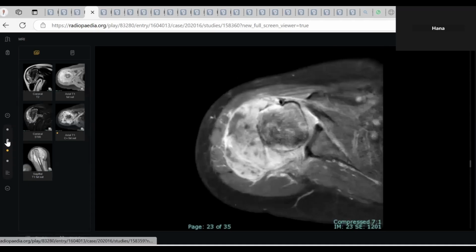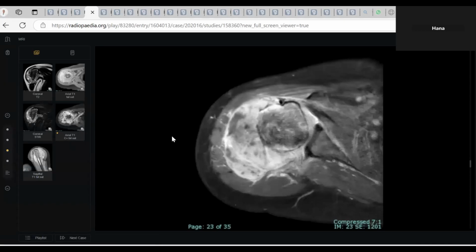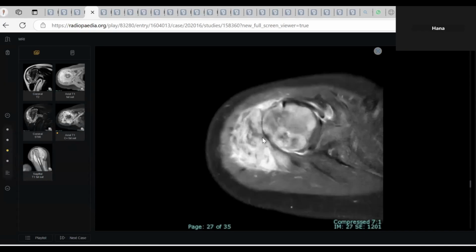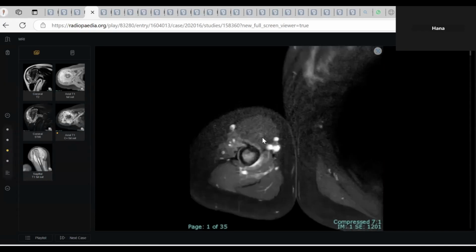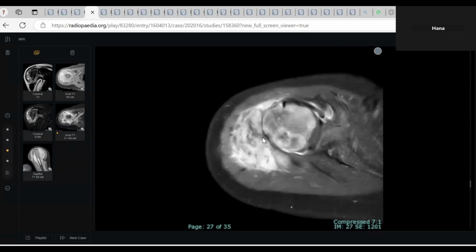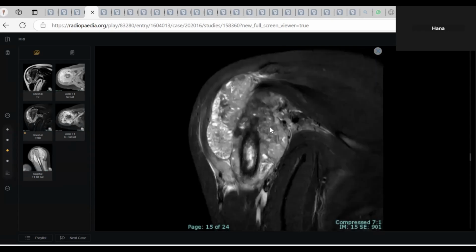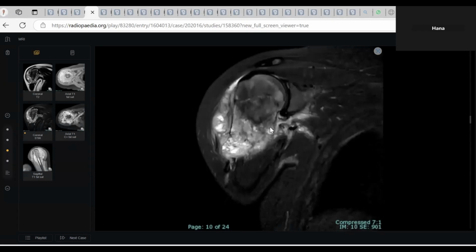This case, you did very well until you insinuated yourself into a big problem. What do you think? After I show you this one, you should tell me. I will also put infective process. Very difficult. Yes, you are right, I demarcate you. I was giving you 7/8, then after this word only, because there is a large mass.